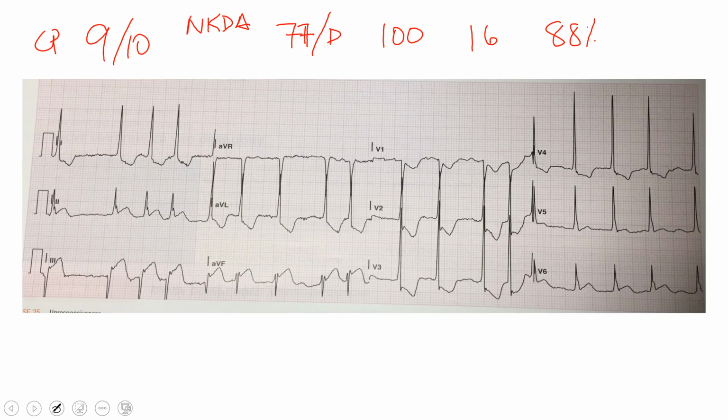All right, so let's first start taking a look at our 12 lead here. We've got some things that stand out to us. Right away, we want to find out what our rhythm is, right? It would be nice to have a nice continuous lead II or whatever lead you chose, but down here, we don't have that. But let's remember our rules for atrial fib. Number 1, no discernible P waves. Number 2, the presence of fibrillatory waves or F waves, as well as irregularly irregular.